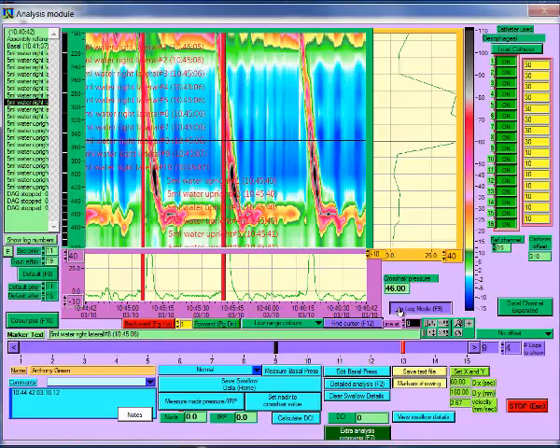In log mode, the black marker on the purple bar shows the position of the beginning of the data, and the red marker shows the position of the end of the data. You can also change to data log mode by clicking on the purple bar at the point in the file that you wish to examine.